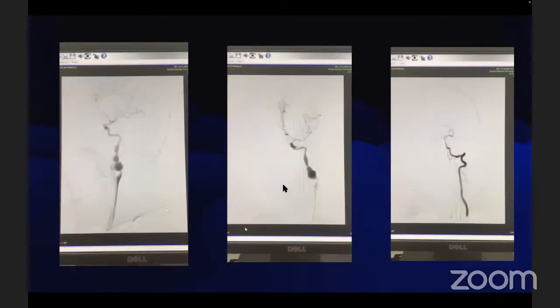There are definitely multiple aneurysms, which are usually not evident in fibromuscular dysplasia. It only produces stenosis and dilation, though very rarely cervical aneurysms have been reported. In this, we can definitely appreciate the cervical ICA aneurysms, not just one or two aneurysm-like structures.